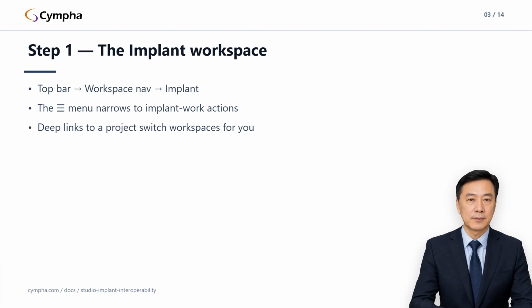And often you won't even do this by hand. Opening a project deep link from a colleague's email or a shared URL switches you to the implant workspace automatically. So the manual switch matters mainly when you're starting from local files, which is exactly the situation in this walkthrough. With the workspace set, the loading order comes next, and the order is the part that matters.